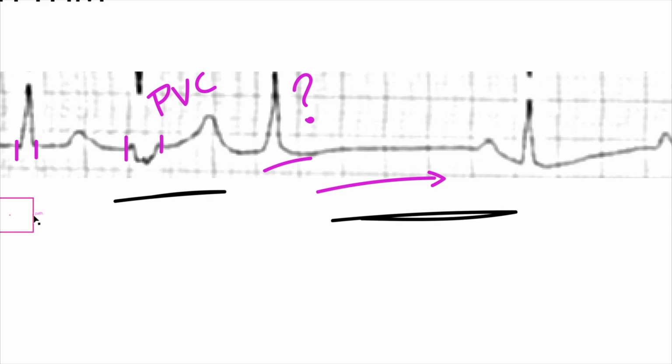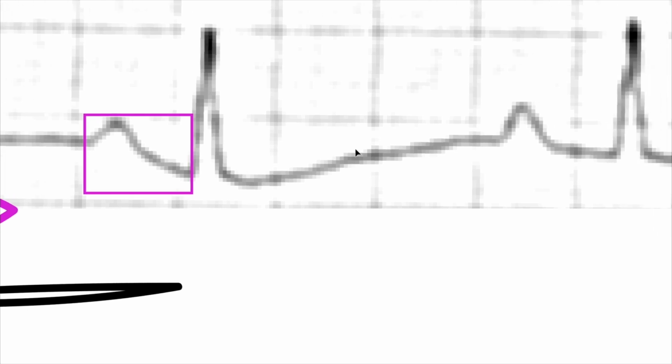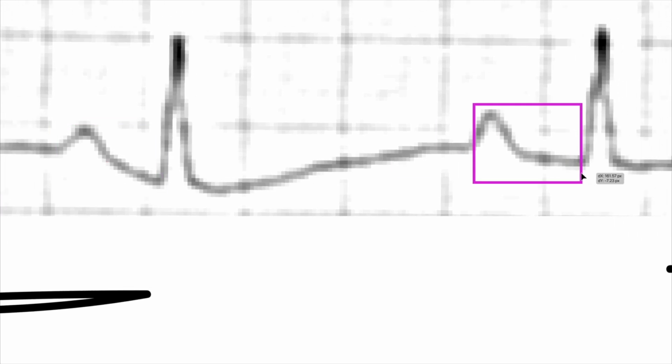And let's see what the PR interval is like here. See how much measuring there is here? I mean, I'm really measuring stuff out. Yes, okay, partially this is an informative educational video, but this would be no different than if somebody handed this over to me. Now, this PR, I would say, is consistent with all other PR intervals with the exception of the first one. And then here, this one gets a little bit longer.